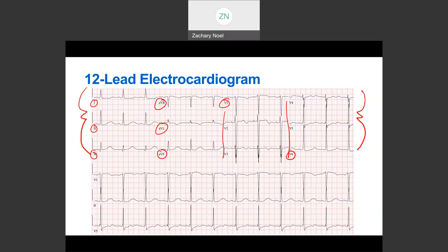If we direct our attention towards the bottom half of the electrocardiogram, we will see that there are 3 different leads that span the entirety of the electrocardiogram strip. So we get essentially a 10-second strip, so to speak. Now, going into the nuanced detail of how they get this and where the leads are placed and things like that, that's beyond what I want to do for this session.